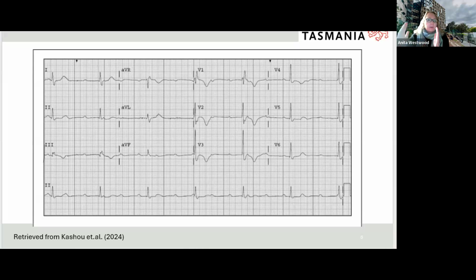Then you look at the ventricle rhythm, and that should also be regular. In this instance, it's a narrow one, so I'd argue that the generation for this rhythm is occurring high up in the His or at the top part of the ventricle. But here, they've got two things that are occurring independently. The atria does not communicate. It's like someone's poured cement through the center of that junction there. Does that make sense? To maybe expand on your point, Anita, we can have different types of third degree block.